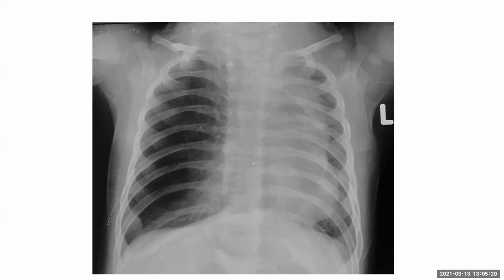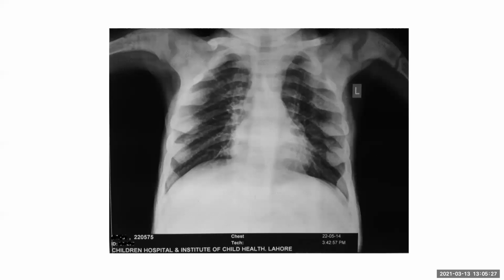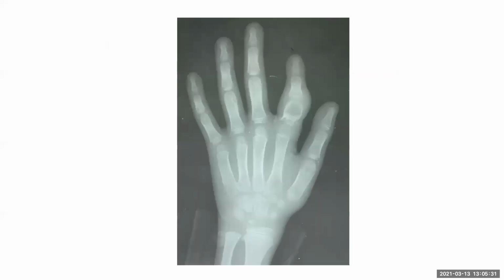Then the tuberculous dactylitis case, somebody is asking, can we add a differential of sickle cell dactylitis in addition to spina ventosa? For that, you have to see the rest of the bones as well. The rest of the bones appear quite normal.